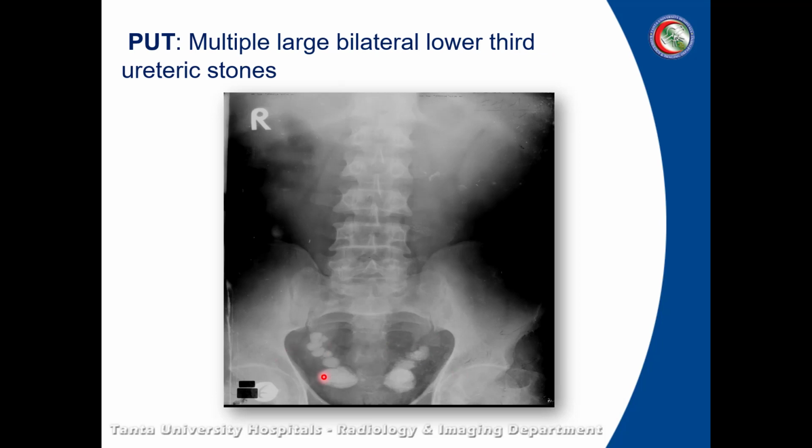Another PUT showing multiple large stones or radio-opaque shadows along the course of both lower third ureters. So the full comment of this image is PUT showing multiple large lower third ureteric stones on both sides.